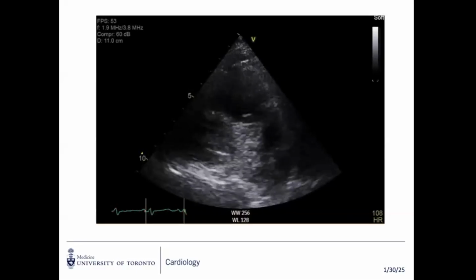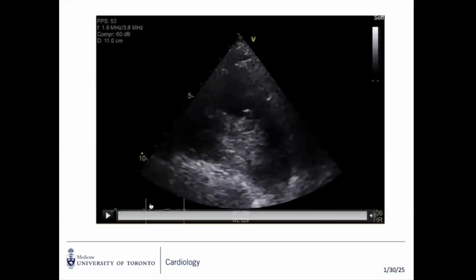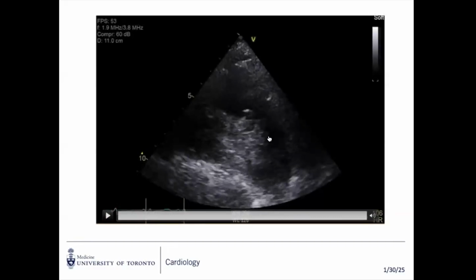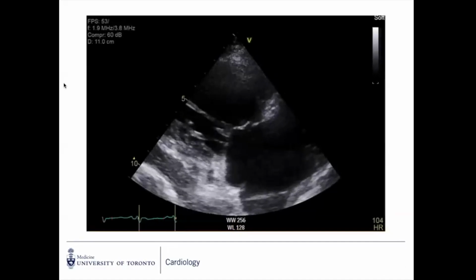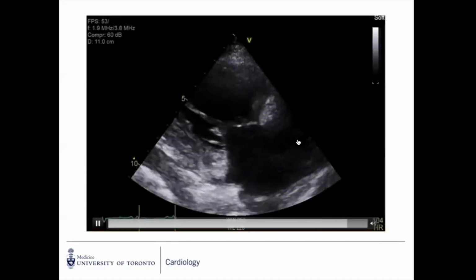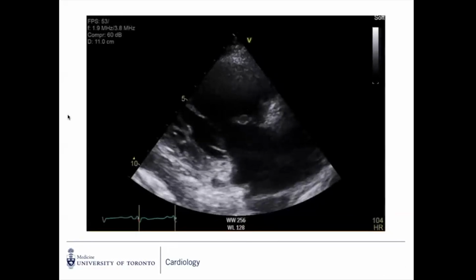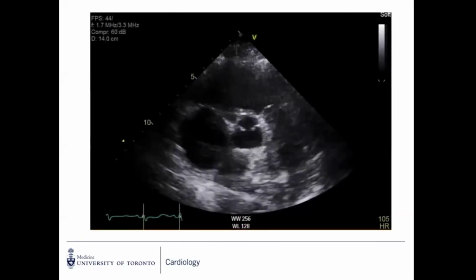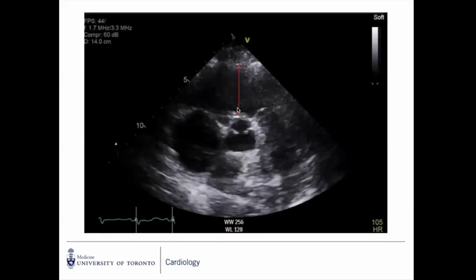Here in your outflow, you can see visually the RV flow tract. You can see the PA looks reasonably enlarged, but again, there's some fuzziness that prevents you from really getting good measurements there. This is your inflow view. You can see the RA significantly enlarged, the RV significantly enlarged. I didn't include any Doppler so as to not obscure anything and confuse us, but here at the level of the short axis, I put this measurement in here myself, and this was quite enlarged.